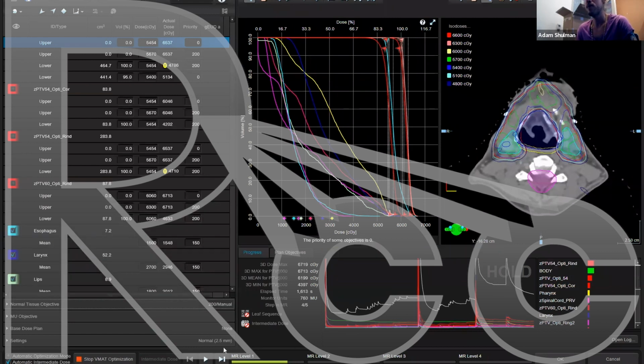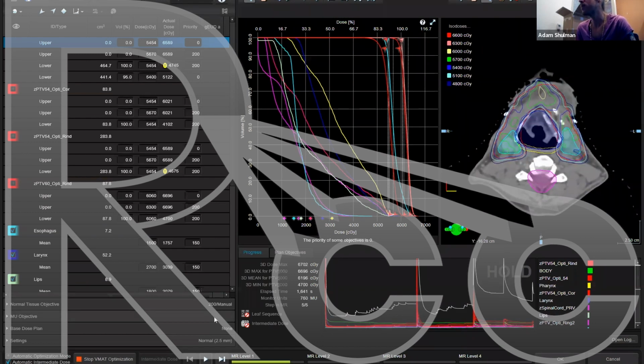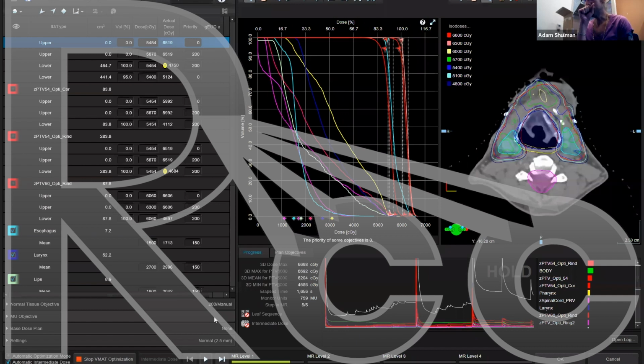So it's not quite done, but for the sake of time, I'm going to go ahead and unpause it so we can move on to the next steps and finish this optimization. And I will ask any participants out there, if any of you have any particular skills in computer programming or scripting, there are some projects that I'm working on, and that hopefully I'll be working on with University of Colorado, on some really cool uses of this planning technique, but with global implications.